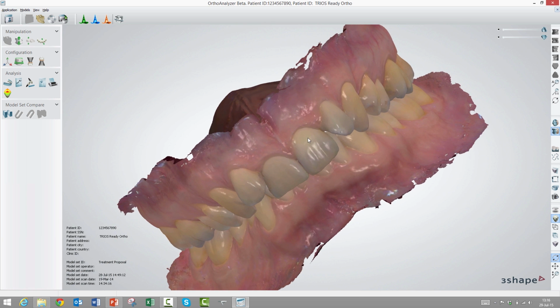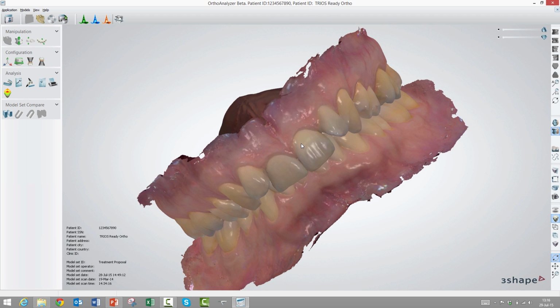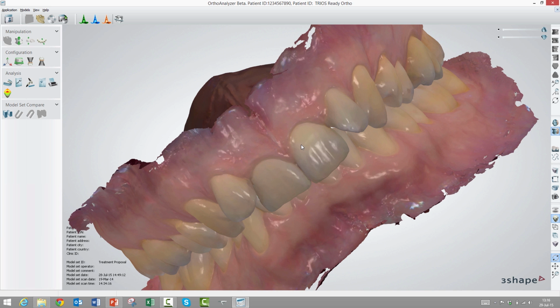And finally, if you have a scroll wheel on your mouse, you'll be able to zoom in and out, as I do here. So we really recommend that you have a mouse with a left, a right, a middle button, and also a scroll wheel. So there are ways that you can configure how the right button works, and I'll get right to the first couple of tools here in the visualization toolbar here.